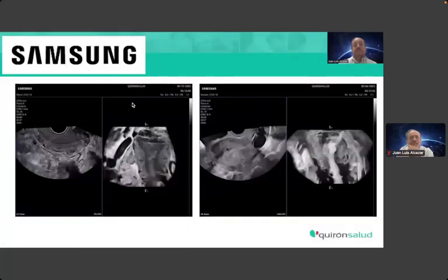Here you have 2 examples of the coronal view obtained in an adenomyotic uterus. If you compare this coronal view by tracing the endometrial cavity, as you can see here, you will see that the endometrial-myometrial junction is interrupted, inexistent, actually not visible, or irregular, as you can see, which are clearly signs of adenomyosis.